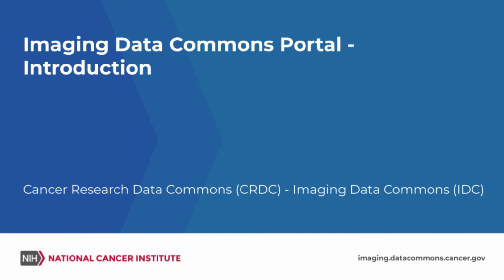Hello, I'm Andrei Fedorov from the Imaging Data Commons team, and in this video I want to give you an overview of the Imaging Data Commons portal.